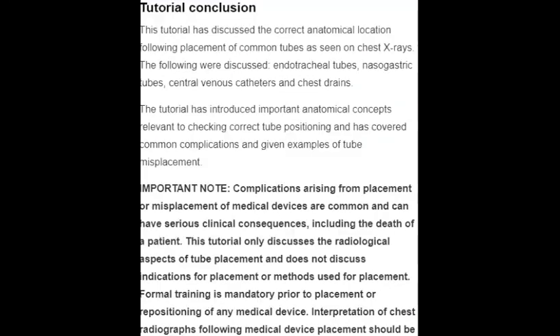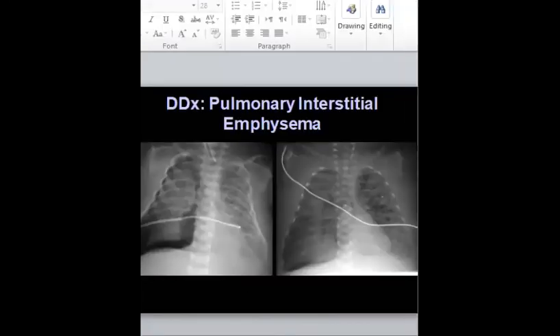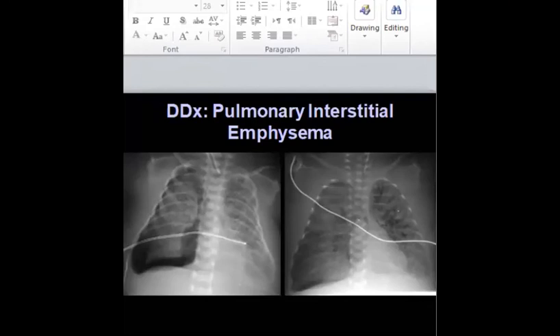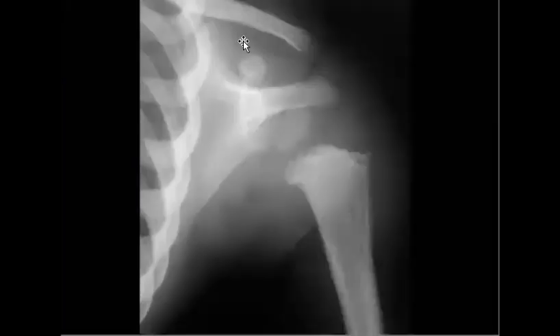Let's go on, I think we mentioned most of them. So we will go to another case, to shift to another issue. Yes. What do you think about this one?